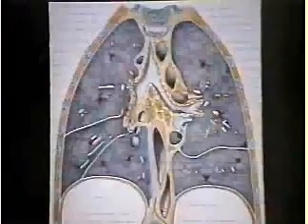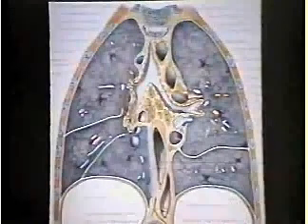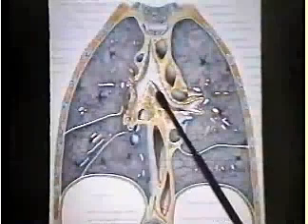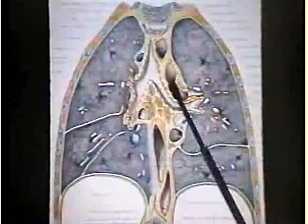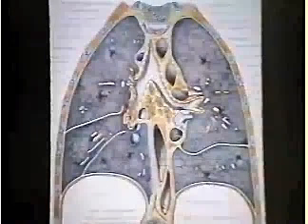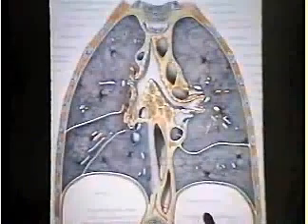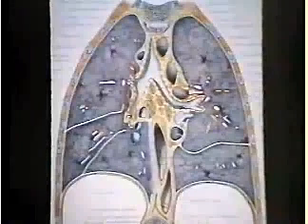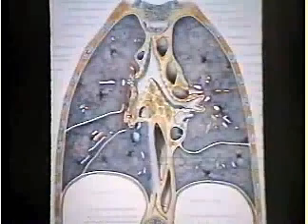Now let's look at the anatomy diagram first. The artist, once again, in portraying the lymph nodes in this region, has showed us nodes which are clearly pathologic in size. The aerated lung should come in well underneath the carina with very, very little tissue between the bronchi once you get past the carina itself. A very thin layer of tissue should be present there. Notice the proximity of the subcarinal region to the esophagus. And indeed, the esophagram is a useful tool in appreciating large masses in the subcarinal region.